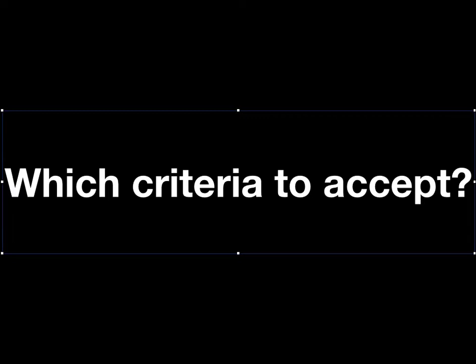So keep in mind that the current criteria are not written in stone. If you don't see cardiac activity with a crown rump length at 5 millimeters, there still is the potential that this could go on to be a normal intrauterine pregnancy. The other thing to keep in mind, a lot of these measurements boil down to how accurate your caliper placement is. And I think that's a separate discussion in and of itself. But just keep that in mind.